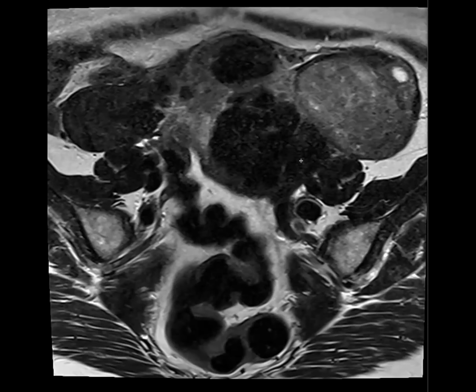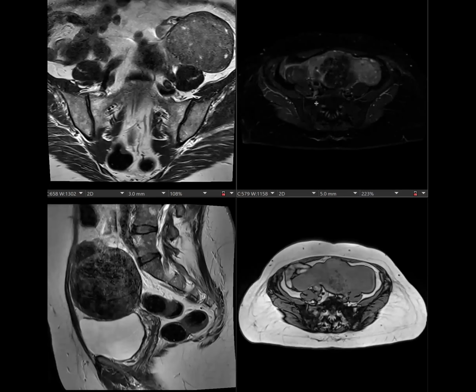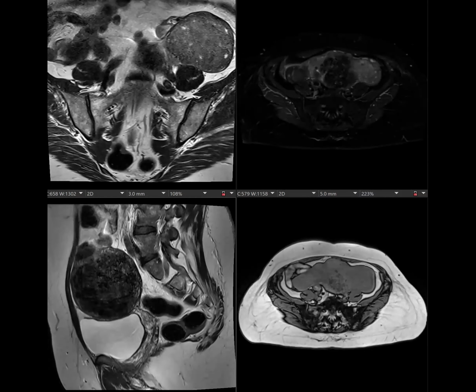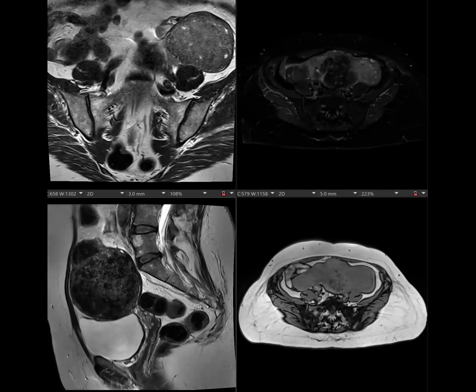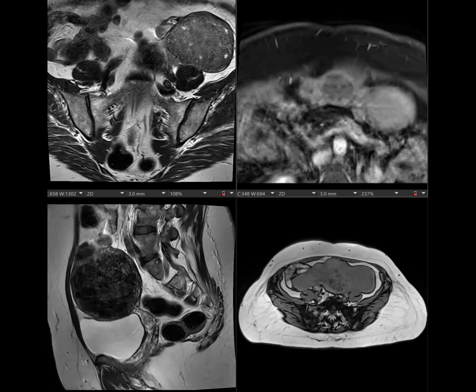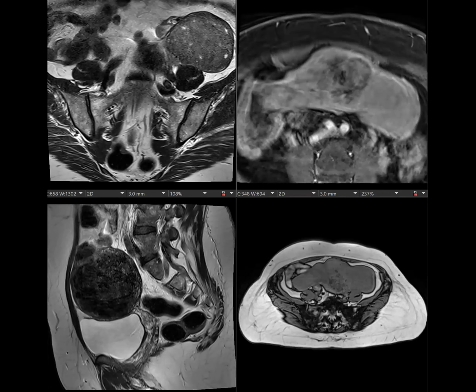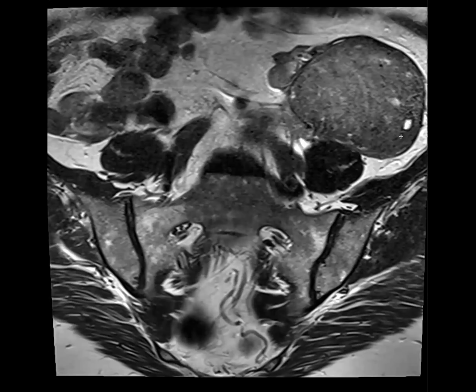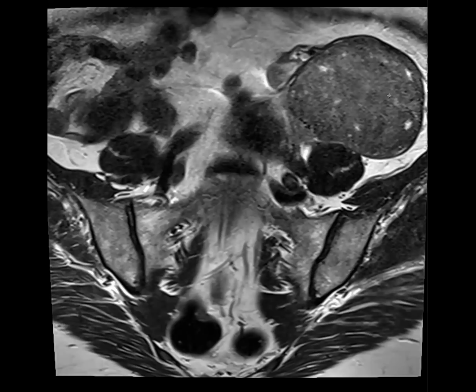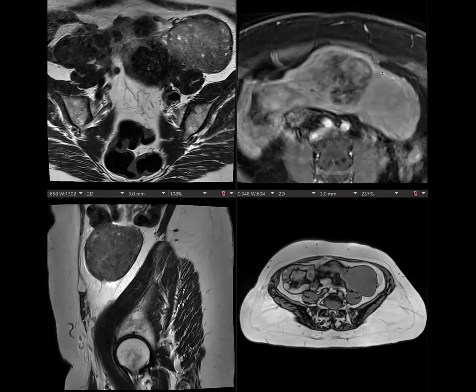from adenomyosis. For sure, it could still be adenomyosis, but when we look at this, we go through that consensus statement that Nicole Hindman and team wrote, and we reviewed already several cases. And I have some additional information and knowledge to shed after this case, or as part of this case discussion. So there's the mass here, right? It's uterine subserosal, and so it's T2 intermediate. So it's enhancing. All of this is enhancing.